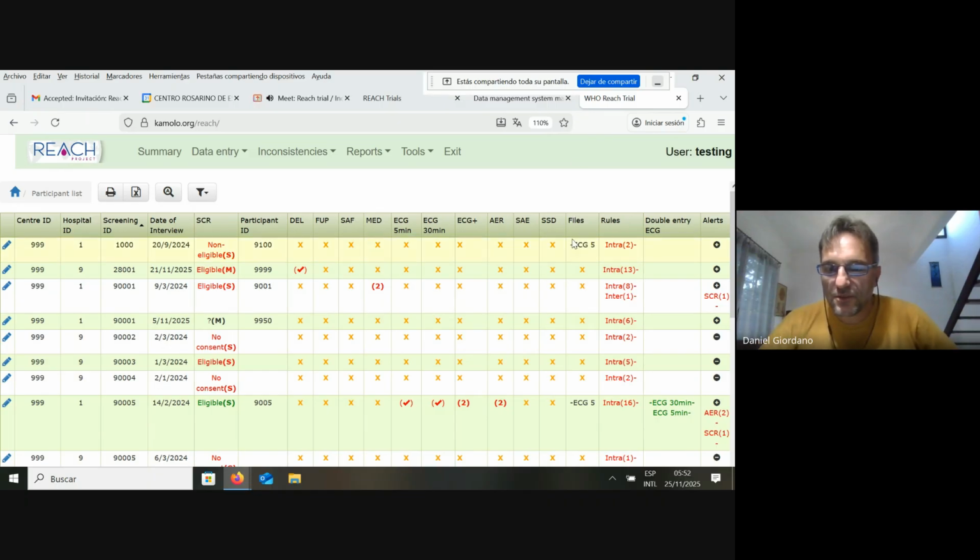You also need to upload this picture. Okay, there are two pictures for each of the participants, corresponding to the blue drape and the green drape.